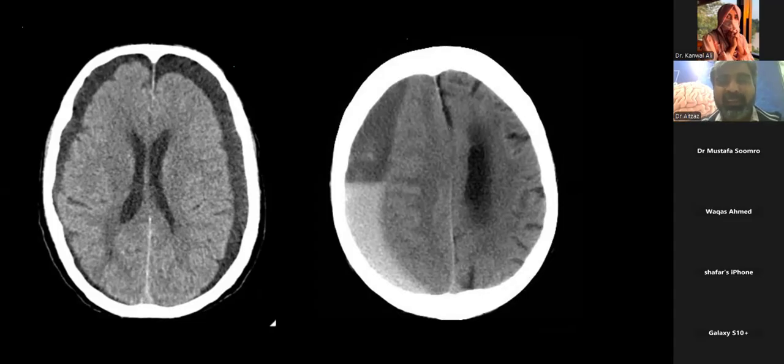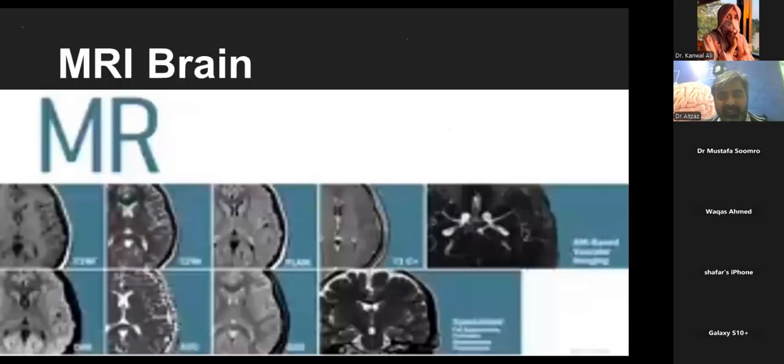What is the bridging vein sign? Yes, the cortical vein sign or bridging vein sign. What is it? Sir, the bridging veins are visible in subdural hematoma, but in the case of hygroma, they are absent. Good. So we have completed the landmarks and density of the CT scan.